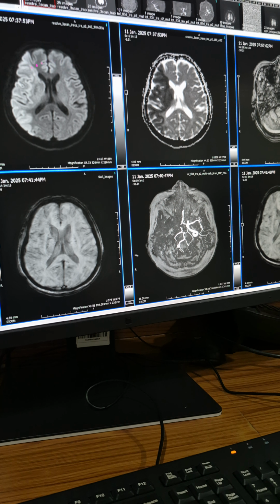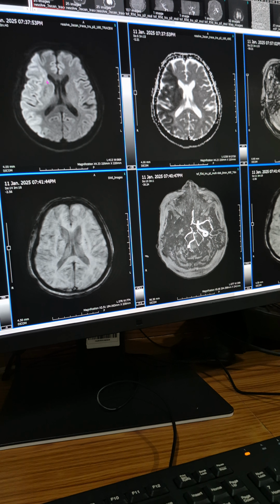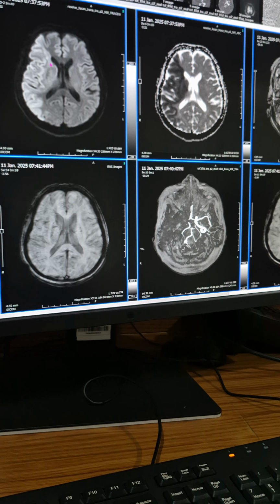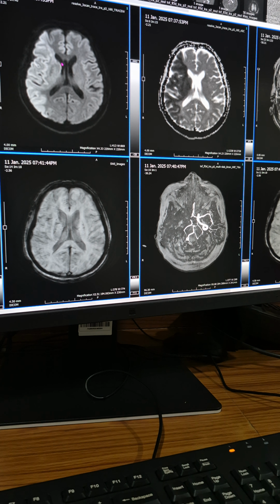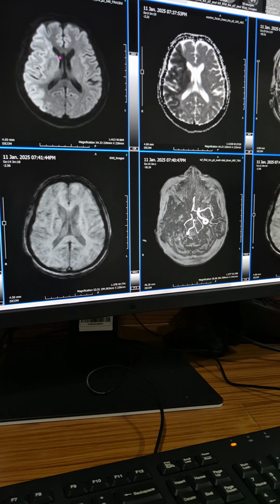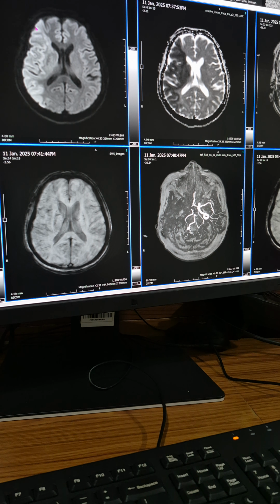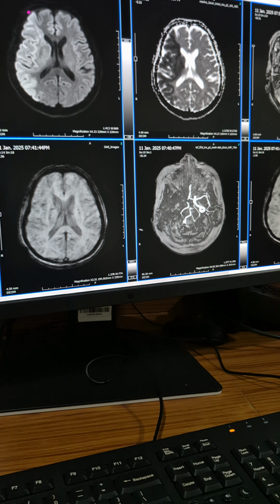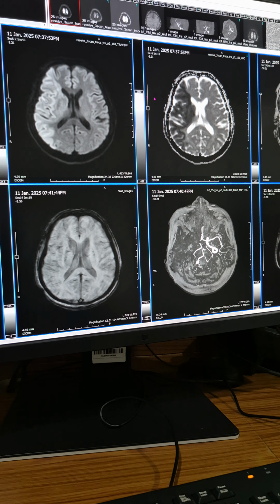This definitely means that the water molecules in this part of the brain are not diffusing. They're not moving in and out of the cells because of the severe hypoxia and ATP deficiency. The sodium potassium ATPase is not working. The cells have locked in all the sodium within themselves, and potassium is out of the cells. Water is not moving in and out, and what this imaging does is pick up water that moves in and out, so because the water is not moving, it shows bright signal in DWI, dark signal in ADC. So this is a stroke.